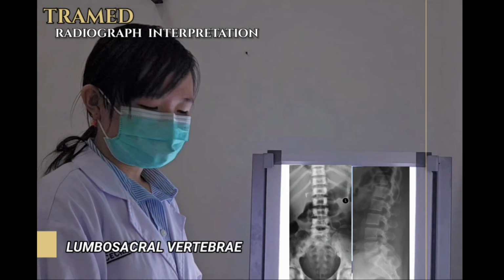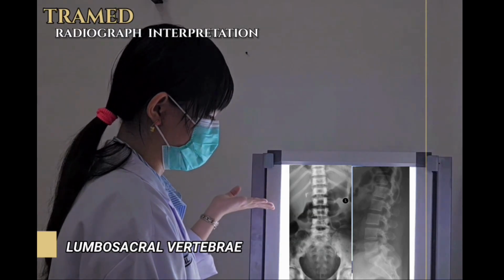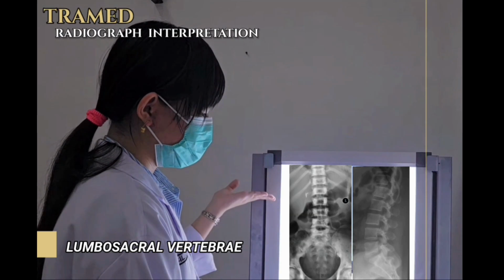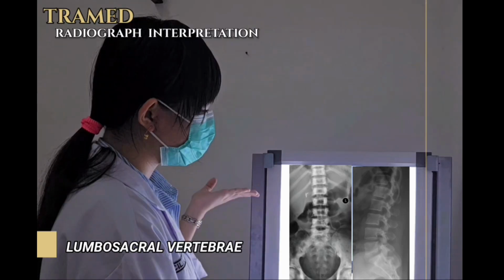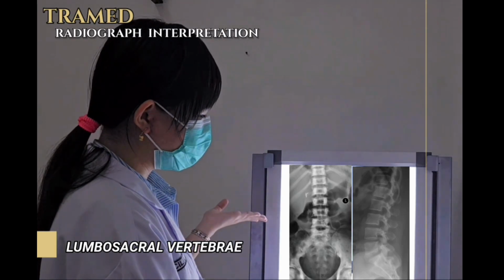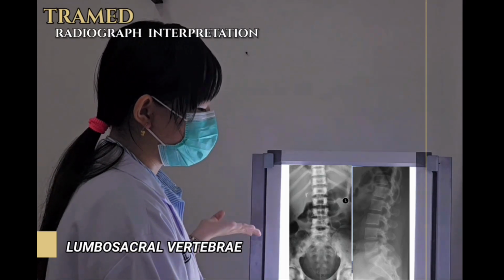So for the lumbosacral vertebrae, first we must evaluate the image adequacy. For the lumbosacral AP first, it's adequate penetration. We can see the L1 until S5, the spinous processes and also the sacroiliac joint, and the iliac being symmetrical. There is no rotation. The intervertebral joint is visible.